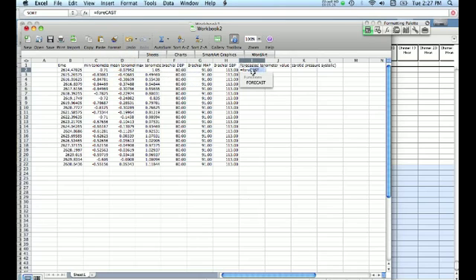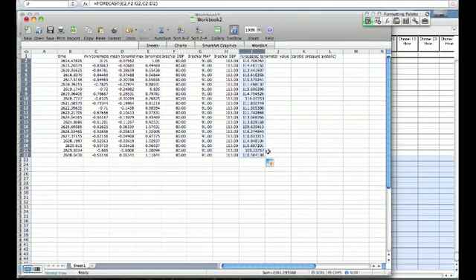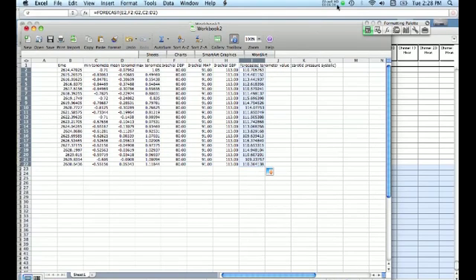So if we type in forecast, and we put a little bracket, the value we want to use to extrapolate and determine systolic blood pressure from is this particular one. Now our known y's would be these two here, and our known x's are these two here. Using that specific equation, we now predict from this relationship what this pressure should be. And you get that relationship right there. If we drag this down, we will know all systolic pressures.